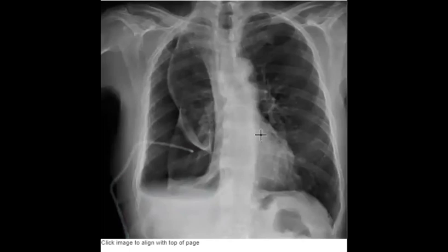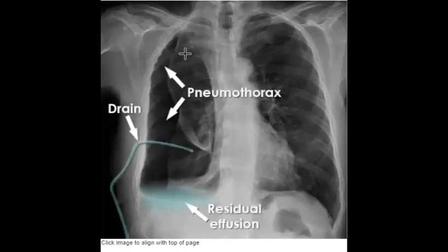Perfect. It is bad because we mentioned that the drain of pneumothorax should be in the superior position. Perfect. So this one, it should be for effusion. Yes, not pneumothorax.